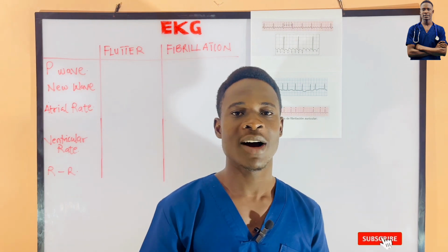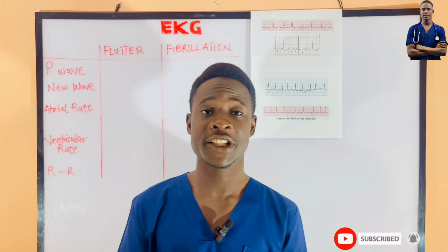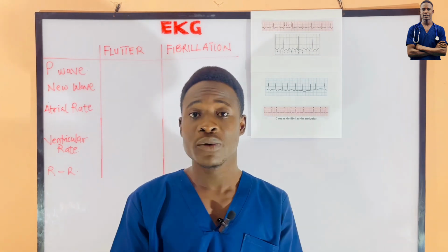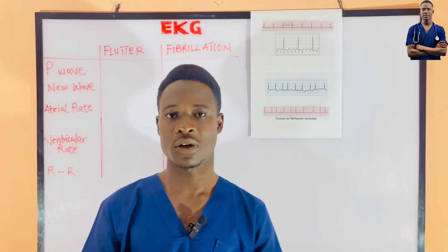Hello guys, welcome back to the lecturer's desk once again. Today we are going to talk about atrial fibrillation and atrial flutter. Now, how are you going to identify them, or differentiate between them using the EKG graph? This is what we are going to talk about today.